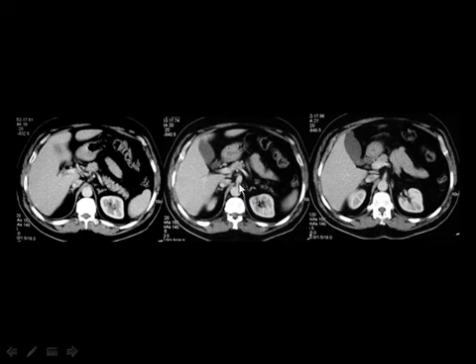And there is a branch coming from the anterior aspect of the aorta. You know that there are 3 branches coming from the anterior aspect of the aorta. The celiac trunk is very short to be seen in the CT scan. The inferior mesenteric artery is very thin to be seen in the CT scan. Then the only vessel coming from the anterior aspect of the aorta that is seen on the CT scan is the superior mesenteric artery. This is the superior mesenteric artery, this is the liver, this is the gallbladder, and these are intestinal loops.